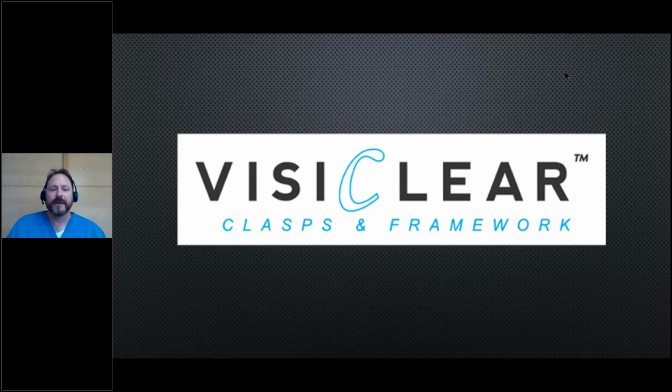So the way the process is going to go, we're going to start out with kind of what the material is and why it's good stuff. Then we're going to transition into the digital design. I'm going to show you 3Shape. I'm also going to show you Exocad, just so anybody out there interested in how these different softwares work. They're very similar to each other. Most partial frame software is similar. There are little differences that are cool. Some have advantages one place where others have the advantage. So they're all really, really good.